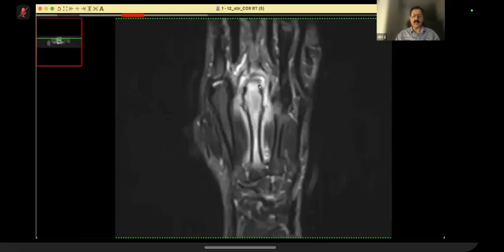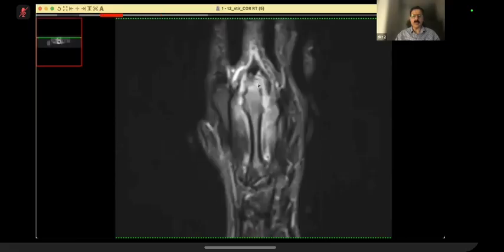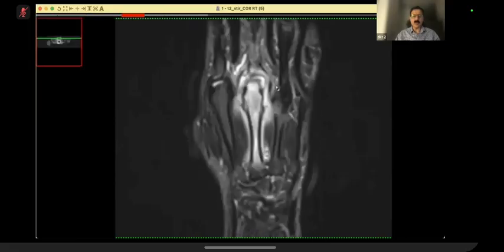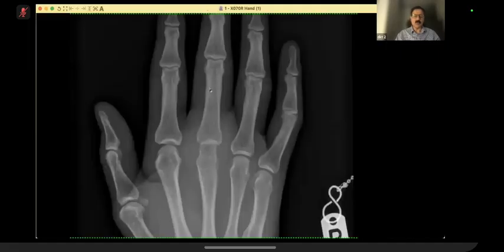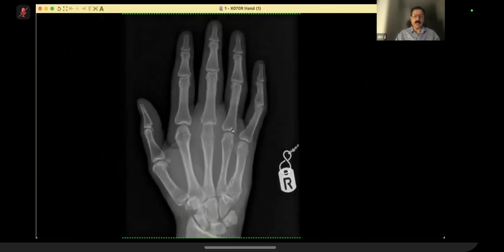So overall, well done. Another thing which I want to correct you is, you said about frontal view of the hand. Please remember that there is no concept of a frontal view of the hand or wrist. It is always a dorsal view. So it's not frontal, and it is always a PA of the hand.